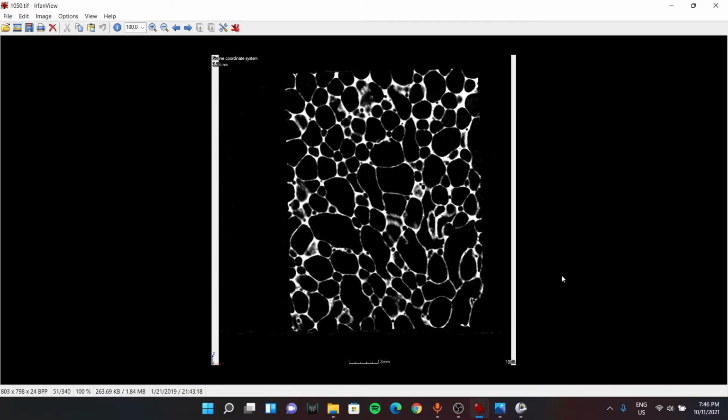Once you install the software and open it, this is how it would look like. You just need to put your mouse at a corner, left click and drag. You will see a bounding box around your object. Carefully align it with the object like this. I'm currently selecting as much of the image as possible, so that we'll get a pretty good boundary. So this is the boundary I got.